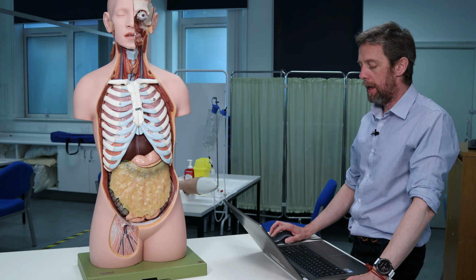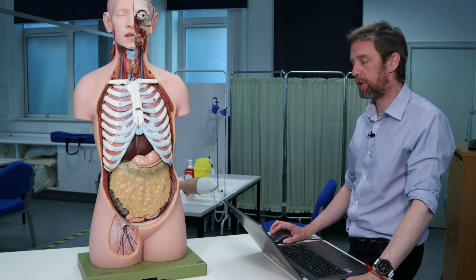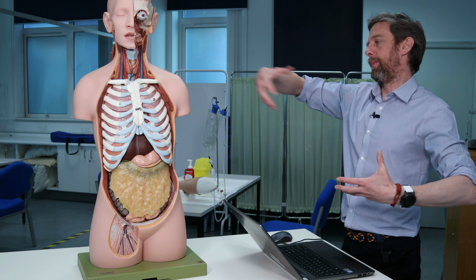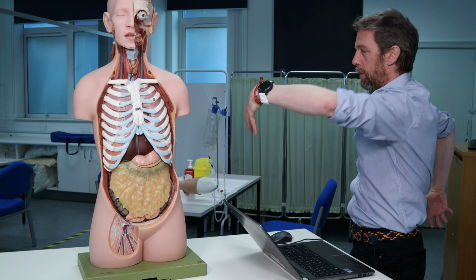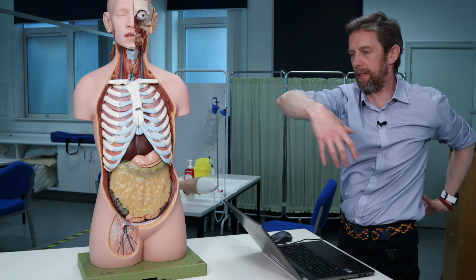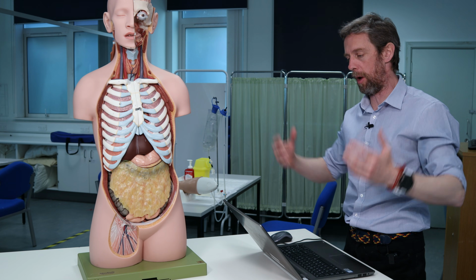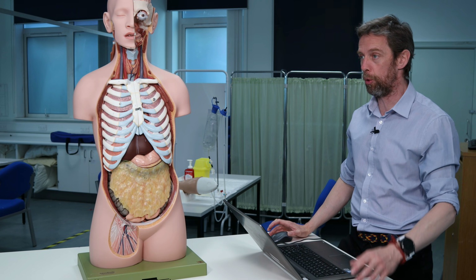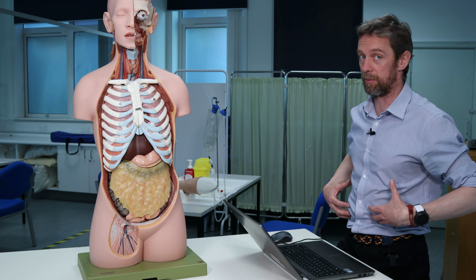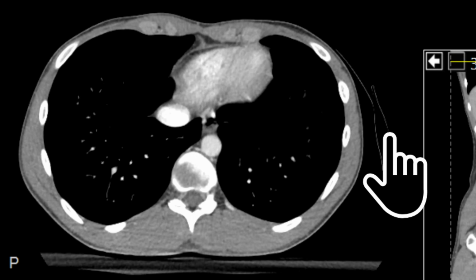Okay, so a CT, a computed tomography image, is created by sending an X-ray source around the body, which is detected on the opposite side. You move it around, take lots of images, send that to a computer, and the computer builds up a three-dimensional image of the inside of the body. Very handy, very cool. I would love to have this done to myself, but I would not like the radiation. And it gives us these images.